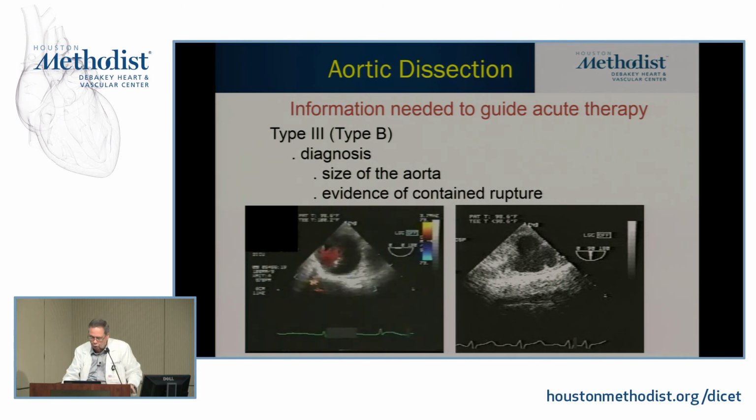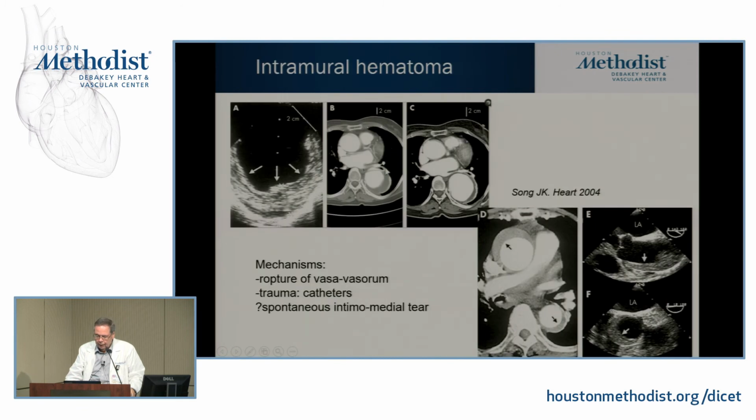And of course, there's always thrombus, because that's what's keeping it from rupture, from free wall rupture. Another example of the intramural hematoma, but this is how it looks by echo. Same story. So FAISAL showed you beautifully this crescent thickening of the wall, and this is exactly what you see when you do your TEE. So it's the same concept.